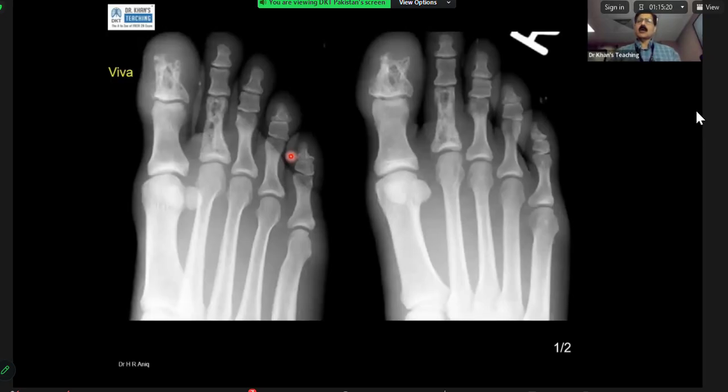So you are giving your thought process to the examiner. You are showing your thought process and then staying firm. So you did very, very well, but just a minor point. Regarding soft tissue swelling, can there be soft tissue swelling in gout? Yes, sir. Correction, in sarcoidosis.